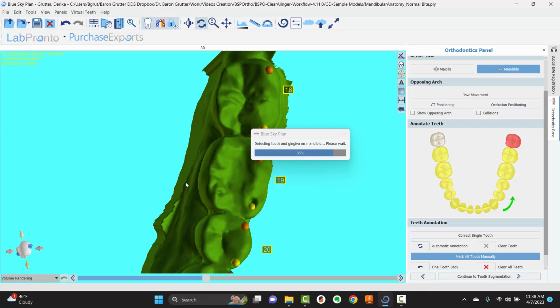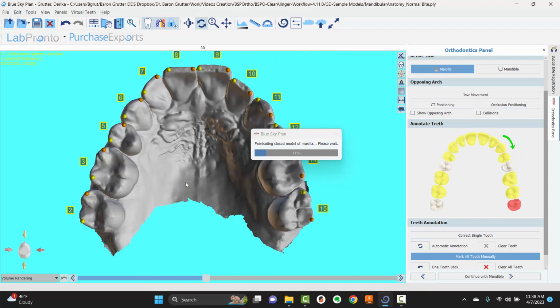As you see, I have not paused the video, or I'm not speeding it up. I'm talking because I just want to show you how quick and effective it is. It's also closing the models. I bring in the open meshes rather than a closed model, because the software is going to do it for me, and I actually think it's better to do that. That's a whole other story that I've talked about before in courses, but it's not that important. Just bring in an open mesh is your best bet. And it's just about ready.